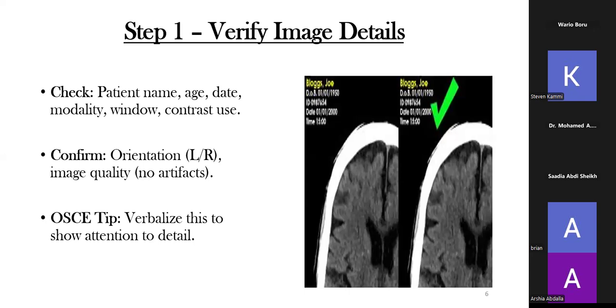Again, a big problem I've seen with students is that people tend to have a problem identifying what is an MRI versus a CT scan. That is what I mean by modality. So at least before the exam, make sure you go through enough images, at the level of the brain, at the level of the abdomen, at the level of the chest, because you can be brought any imaging of any kind. You will be able to see the modality, so please do not confuse any of them.